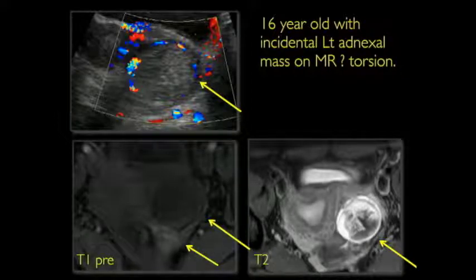You don't want to miss ovarian torsion, even though it has this typical ring-like appearance around it, and that's the stretched parenchyma and internal echogenicity, kind of like hyperacute blood. But it's very important to make the right diagnosis. So in this case, we did move to MRI.